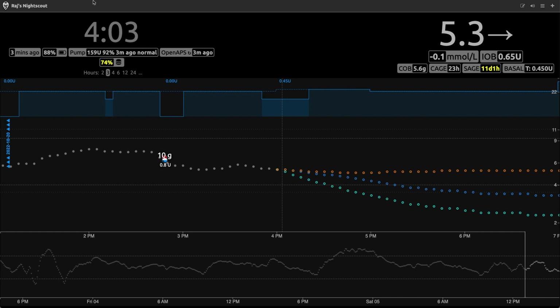Or if you know what you're doing and you run DNS for any of the domains that you may own, then you can easily point that to this IP address, and away you go with a custom domain name or subdomain of your choice. And you can also go about putting an SSL certificate on those if you would like it to run under HTTPS in the future as well.